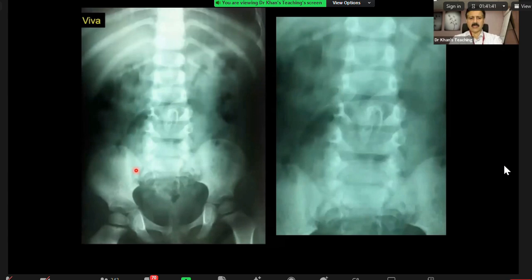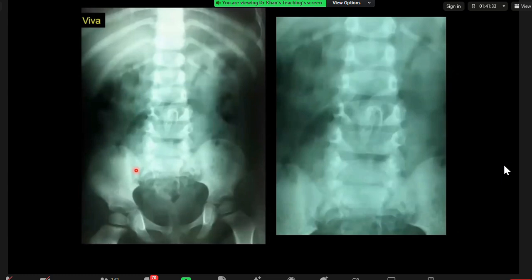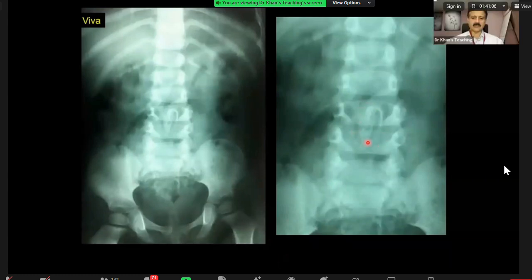So the classical case. Okay, I'll come back to this. What do you think is happening here, candidate 3? So these are pediatric radiographs of the lumbar spine. I think the pedicles appear quite wide bilaterally. And I wonder if there's an intraspinal mass which is causing that. Is there some remodeling of the vertebral bodies? What is this? What is this?